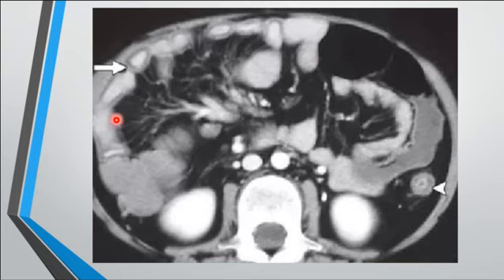This represents sloughed epithelium. The epithelium of the bowel is getting sloughed. In this case, due to chronic graft versus host disease, resulting in necrosis or sloughing of the mucosa of the small bowel, giving this toothpaste sign. The cause appears as a diffuse concentric small bowel wall thickening with a mural stratification and luminal narrowing, but no bowel obstruction. This is small bowel, and you can see the descending colon, also some thickening in the wall and collapsed lumen.